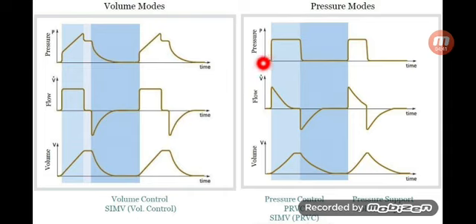On the pressure target modes, you're setting your pressure, so it should be static, and your ventilator is targeting it in a static fashion as a maximum target. The flow would usually be of a descending nature, and then goes, so this is the inspiratory limb, and then this is the expiratory limb. Same here, inspiratory and expiratory limbs. And then on the volume, it's not that much different, but it's going to be changing with every breath because it's not your target. Okay?